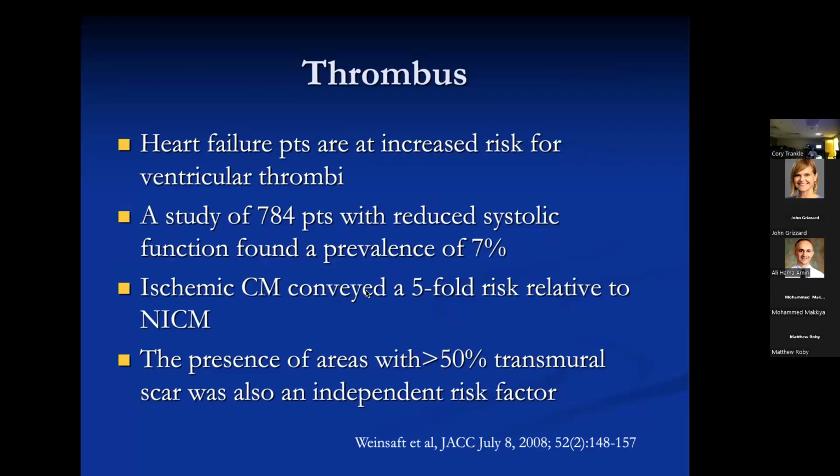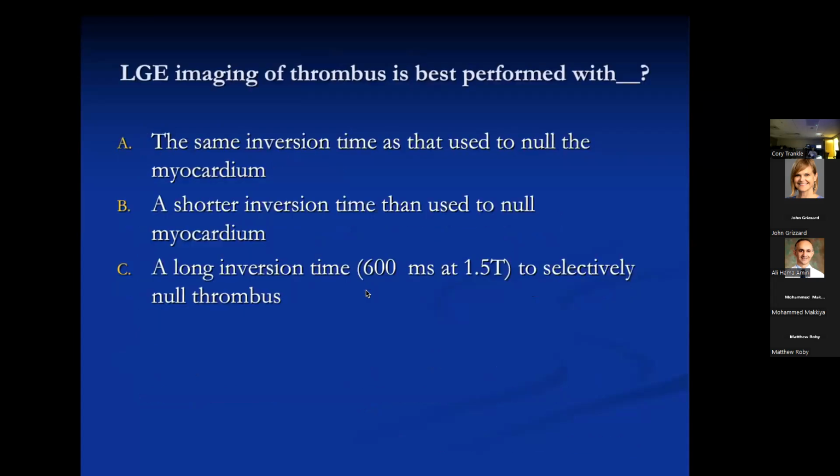You know, if you see delayed enhancement and it's very bright and enhancing, be very careful to look for adjacent thrombi. So LGE imaging of thrombus is best performed with the same inversion time that we usually use for the myocardium, a shorter inversion time or a longer inversion time.